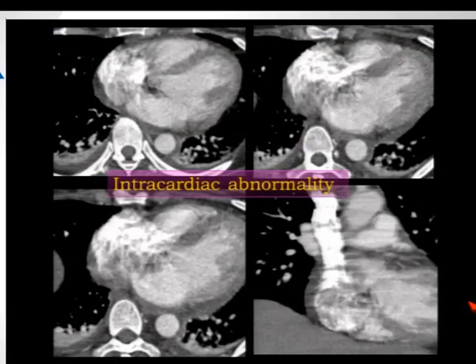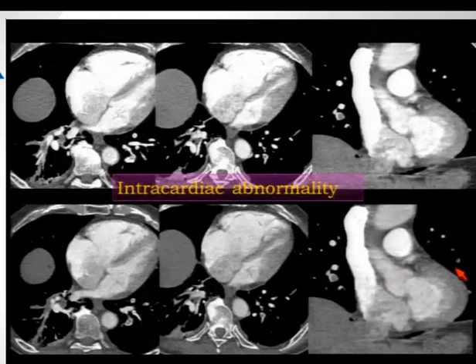We move on to intracardiac abnormalities. I'm going to show you two cases. This one shows an abnormality in the right atrium. Here we see it, in this particular patient. Here's the second patient, again with an abnormality in the right atrium. Are these real or not?